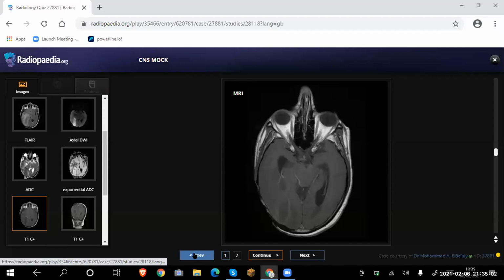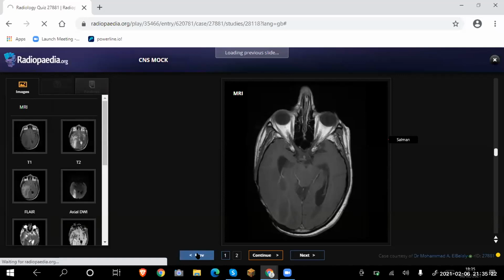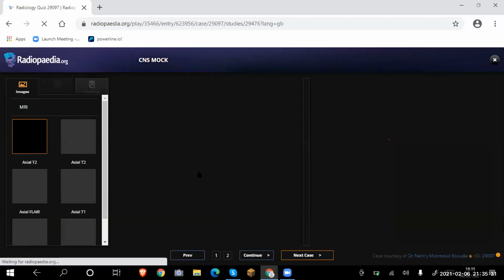Okay. And then the previous one, you actually called it intracranial hypotension, but it is actually intracranial hypertension. I'm also trying to clear it in my head. So there are two different conditions actually. Why is it not loading? Okay. So this particular one is a case of intracranial hypertension. And the features on this case, just a minute, I'm trying to load it. It's always confusing.